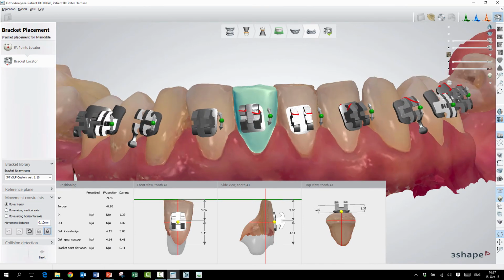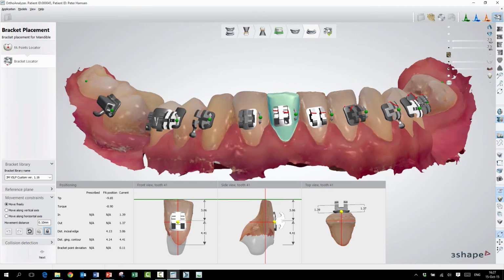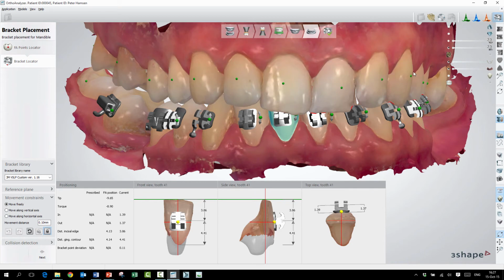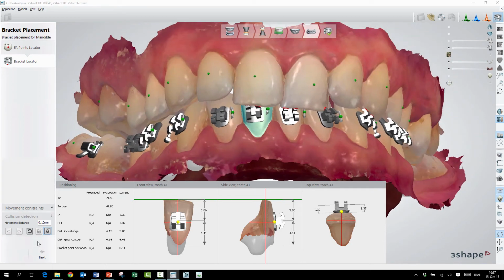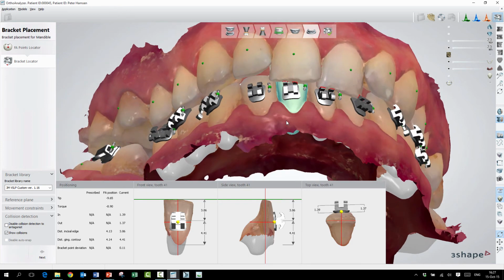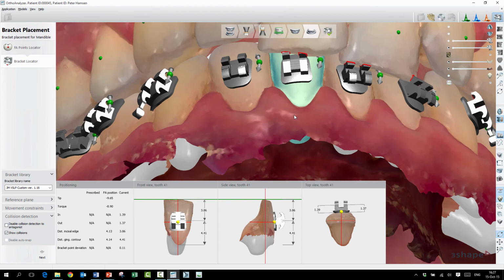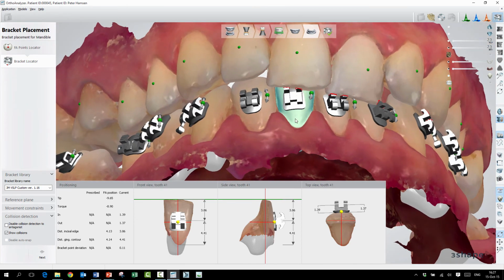I'm just going to remove these ones, but visualize these. Here we can see some outlines that indicate that something is going on. That means interferences with the upper jaw. This we can control and confirm with this. This is because I have enabled the show collision option right down here in the collision detection toolbox. That allows me to quickly visualize where the problem areas are. So what do we do when we have these problems?